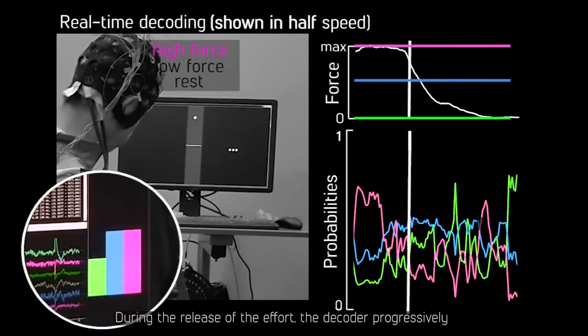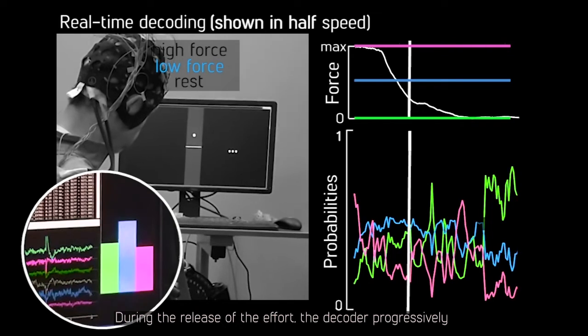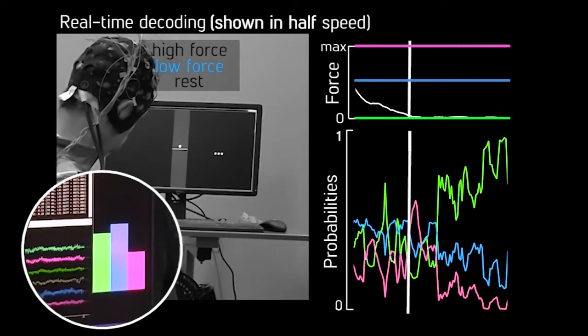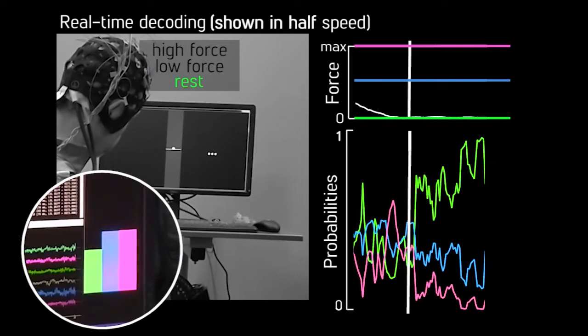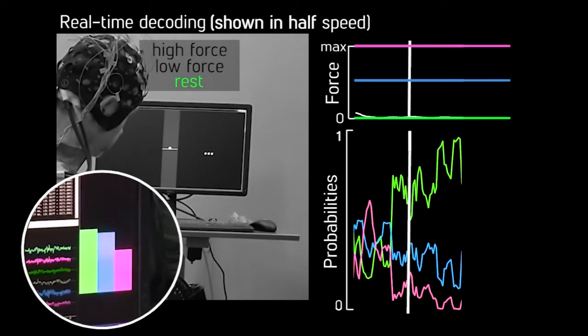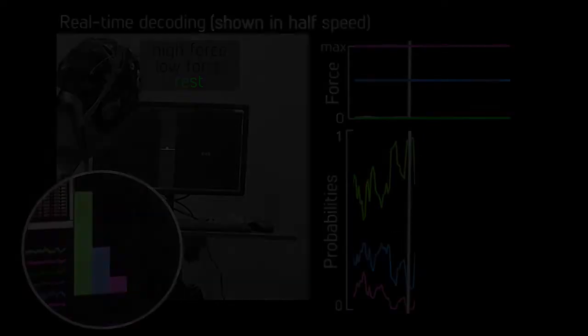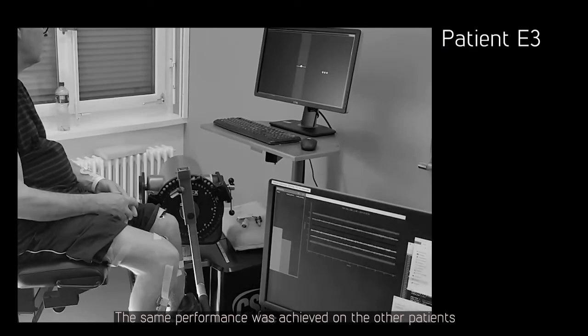During the release of the effort, the decoder progressively predicted weak force and finally rest. The same performance was achieved on the other patients.